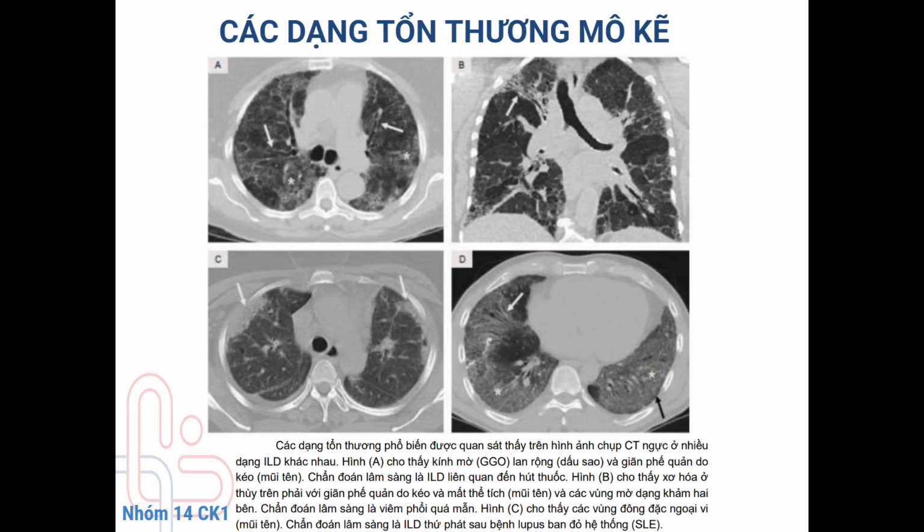On high-resolution CT, interstitial lung abnormalities can be classified into several characteristic patterns, each associated with specific clinical entities. The ground glass opacity pattern suggests partial airspace filling or interstitial inflammation and is commonly seen in early hypersensitivity pneumonitis, organizing pneumonia, viral infection, and non-specific interstitial pneumonia.